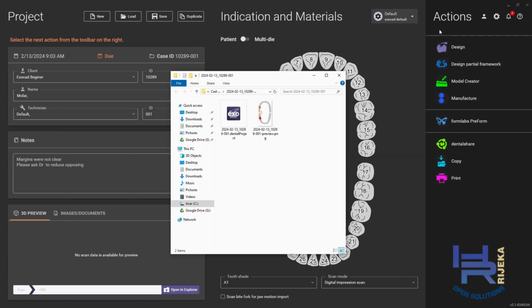Now, in this case, we need to retrieve those files. And it's nice to know how to do this, because sometimes, for example, we have some doctors that will email files for some reason, just because sometimes there are glitches that happen. Just in any case, there are many different possibilities. It's good to know and navigate and understand where the files are.